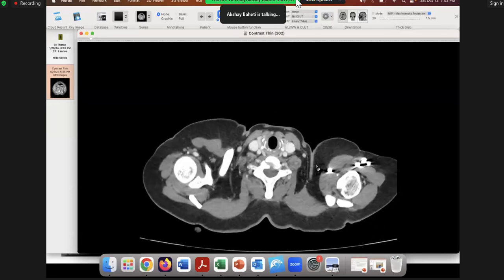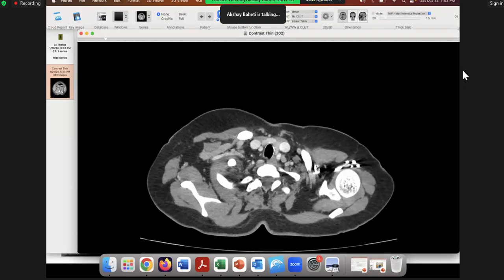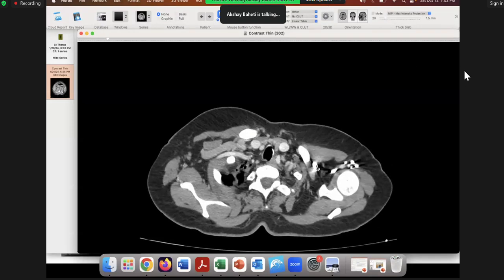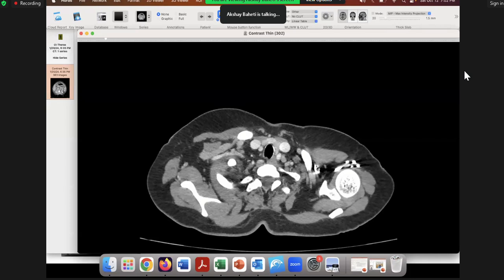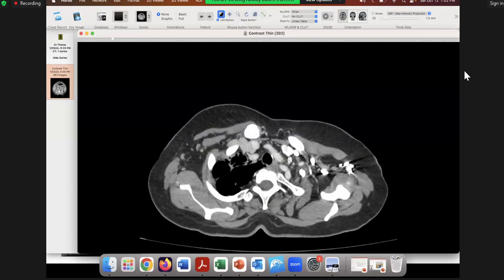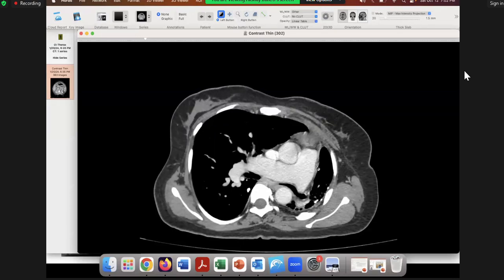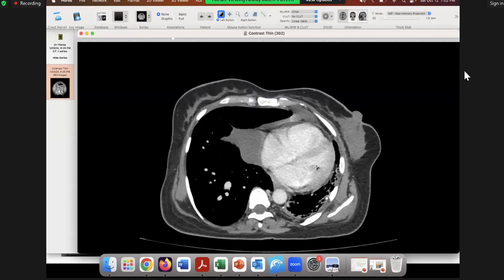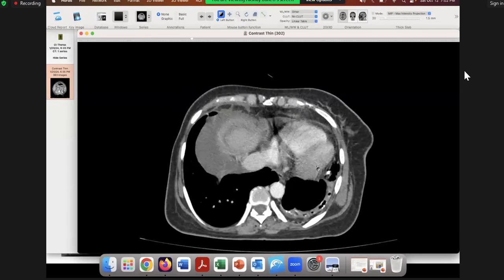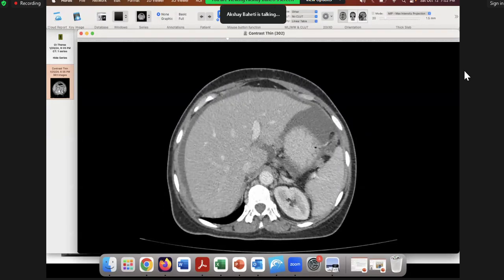Yeah, so what do you say? I'm going to scroll down. Okay, and you can ask me to scroll up and down depending on what you feel like. Who's going to take this? Sir, I'm Aparna. I'll be taking this. Okay, fine, Aparna. All right. So, okay, I'm scrolling. Okay, so you see anything in the chest? Let's just talk of the chest first.